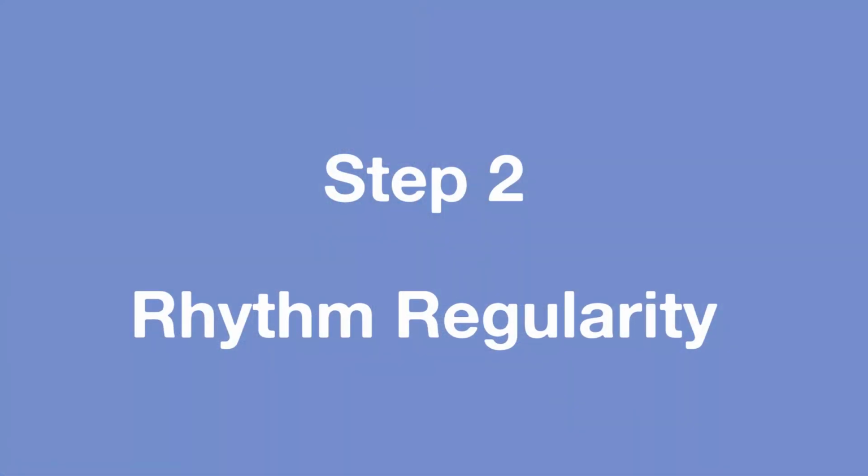That method involves measuring 30 big squares on an ECG, and then you count the number of R waves between that sequence, and then you times that number by 10. So what you're looking at is 6 seconds on an ECG, and then timesing that up by 10 to give you how many beats there are in a whole minute.